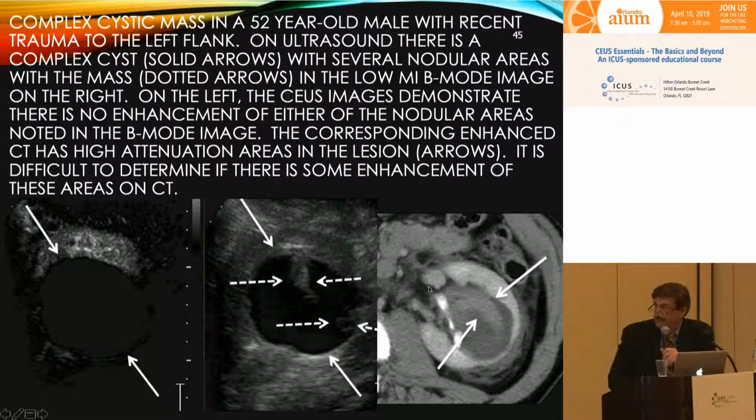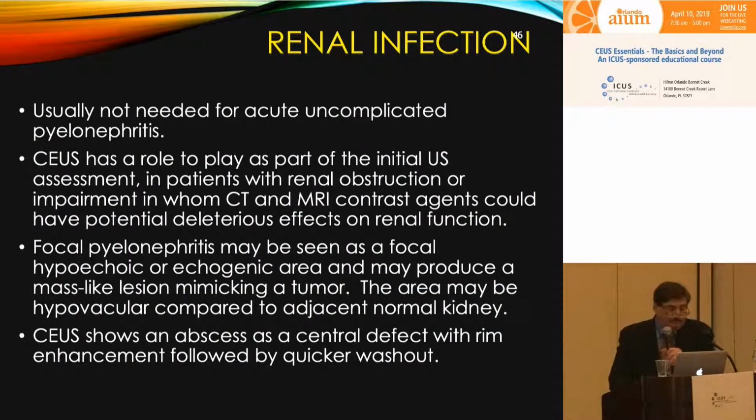This actually is one of our orthopedic surgeons who proves that after the age of 50 you should not play hockey. He got whacked and came in and had this CT that we were worried about having a problem. Here's the ultrasound without contrast. We see some signal, but again, after contrast, there's absolutely no bubbles, and this was just a traumatic hematoma with no underlying lesion, because our concern was, did he have an underlying renal cell carcinoma?